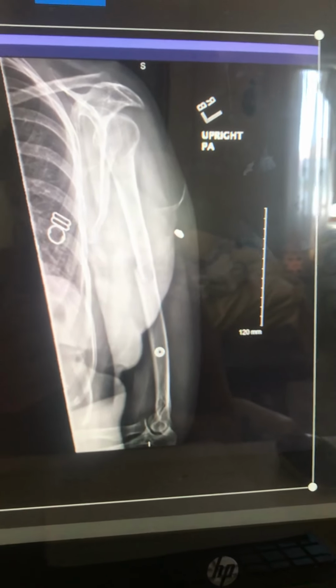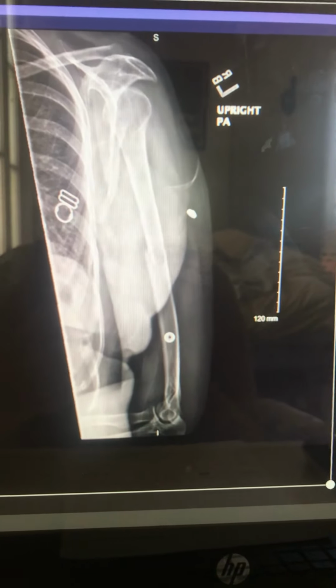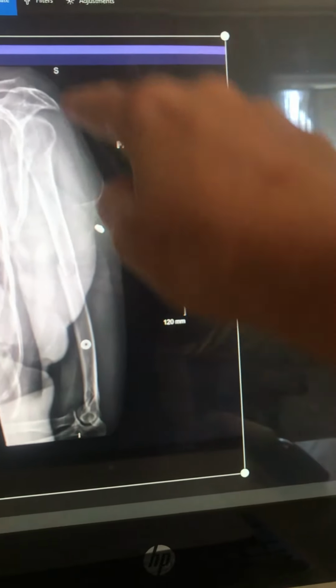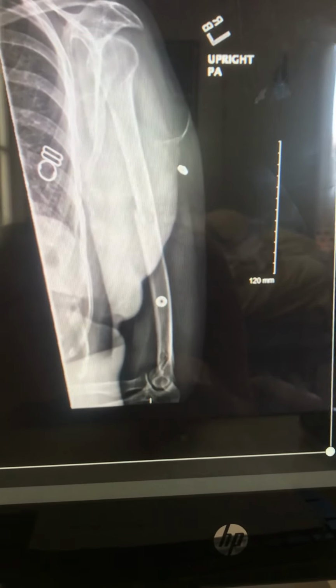It's still diagnostic quality though, it was still okay. The patient's bra again is seen, and the metal clasp snaps from the gown are here. They should have been moved out of the humerus. I think that should have been moved, but it was still passed.